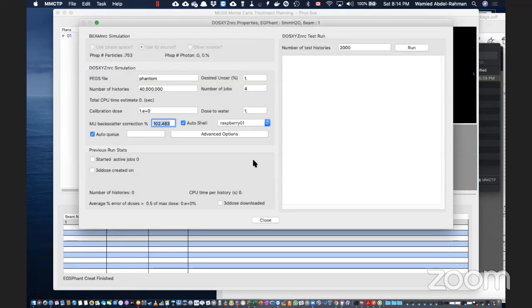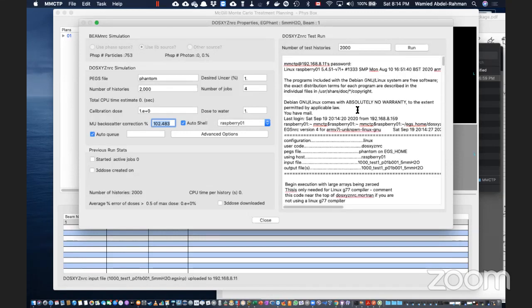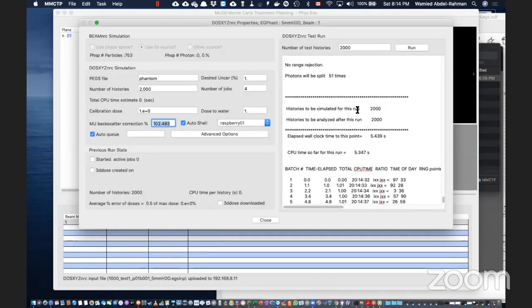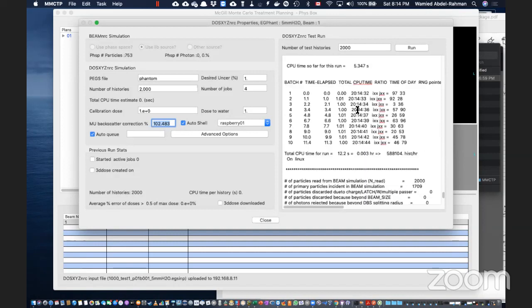One thing you can do, Hamid, is are you going to submit this job or do a test run? Yeah. Okay. We can go back to the images and look at where your ISO center is. There's a little dot that will display where that location is. So I can launch the job and then we will go to the images.